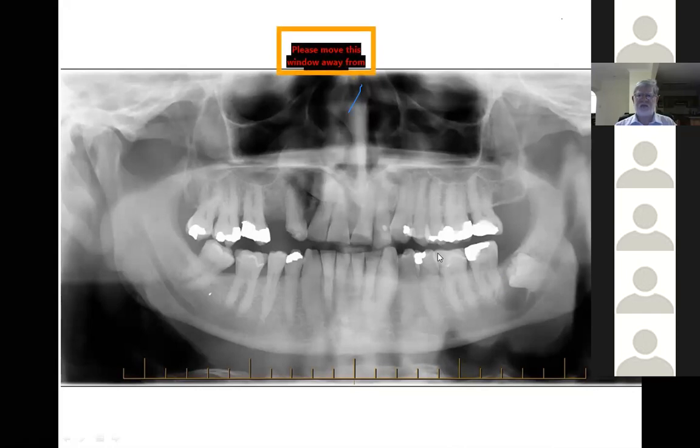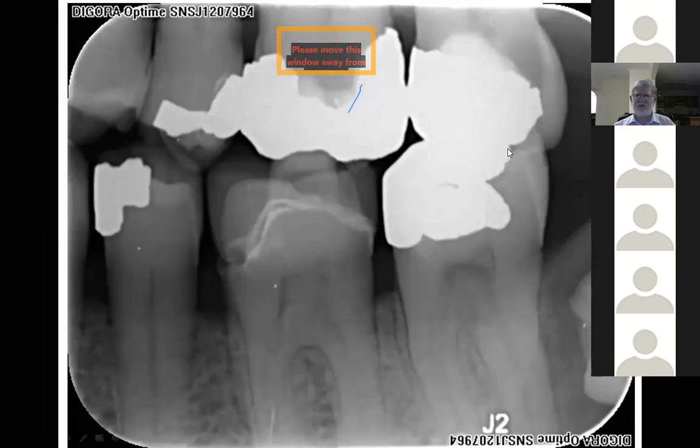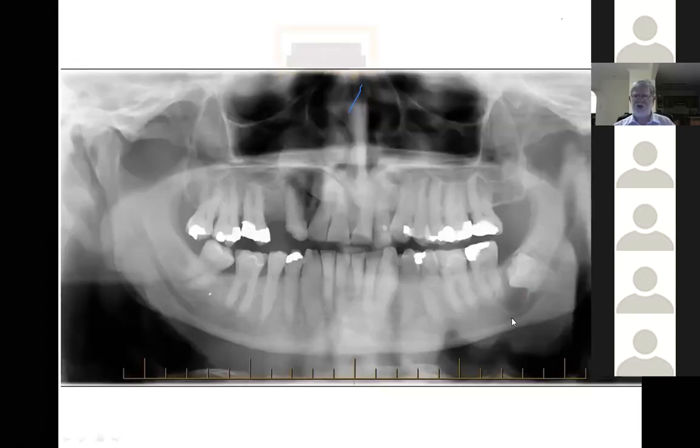Here we were at that. And if we left things be and didn't follow up further, we wouldn't have picked that up. We're seeing this, we're following things up further, and then you're picking this up. Again, massive relationship to the ID canal.